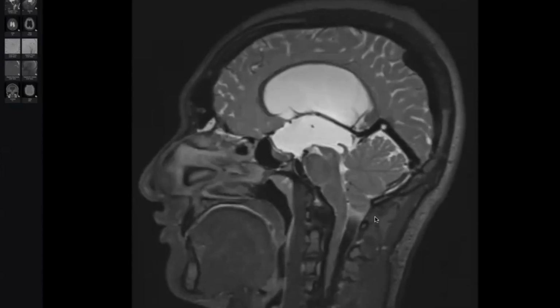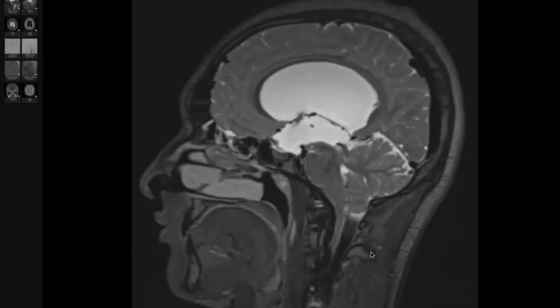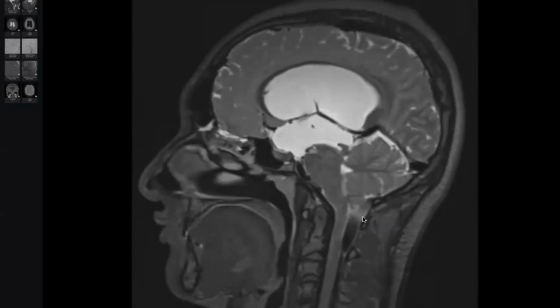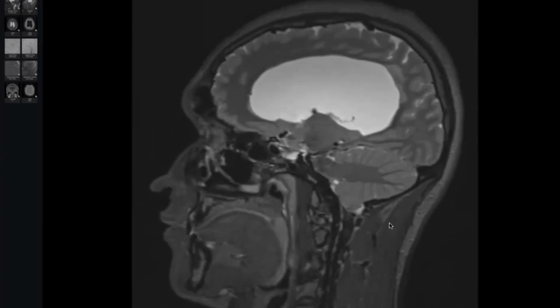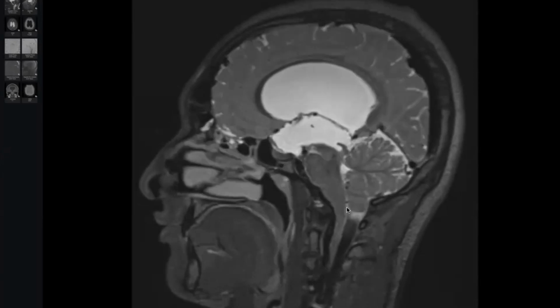But there is also evidence of herniation of the cerebellar tonsils. This herniation is a fatal mistake to miss. Here we are very lateral, but it looks like herniation. It may be herniation, especially as the hydrocephalus is very severe.